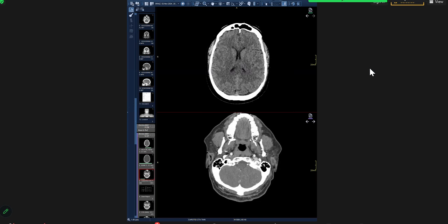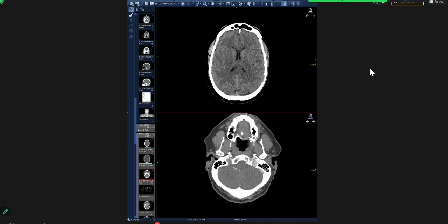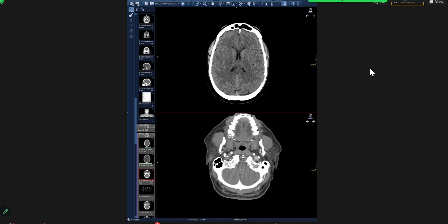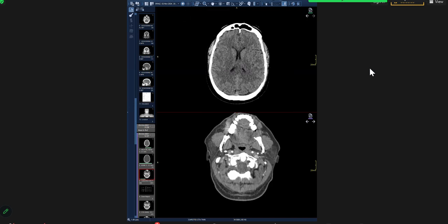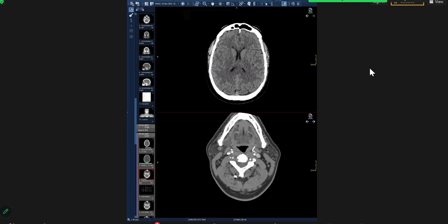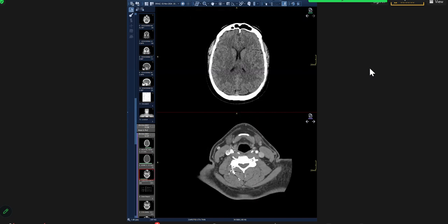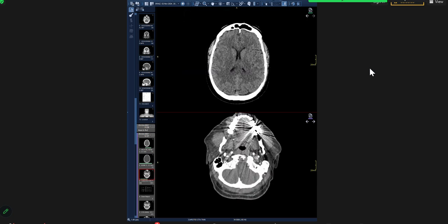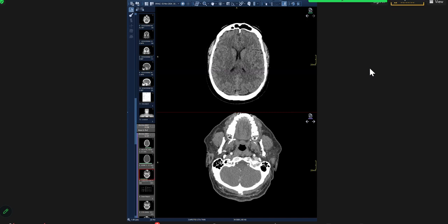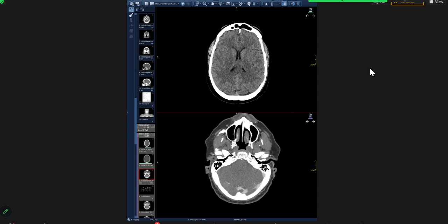So that was the transverse sinus, and this is the sigmoid sinus. And this is the internal jugular vein here forming. See that? And look at it here. You need to trace it down, and you see it's going down. It begins to come up here, maybe a little bit, and here you see it normal. This is it here, and then here there's no internal jugular vein. See this? So it is extending into the internal jugular vein, and this is it.